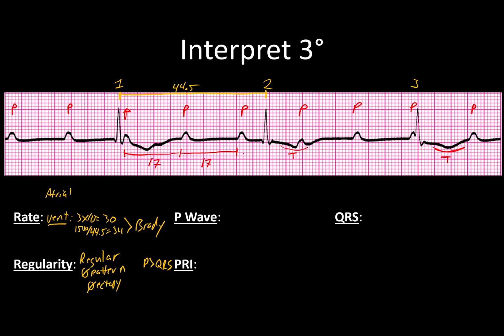And of course I can measure forward just to be certain. A little bit shy, but yeah, 17 again. So my P waves are nice and regular throughout.